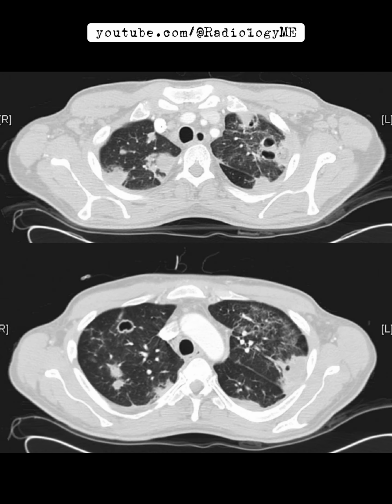Moving on to the axial CT images, and this is where things really come into focus. These images show multiple cavitating nodules, predominantly in the peripheral parts of both lungs. This pattern of cavitation within nodules raises some red flags because cavitating lung nodules can indicate several serious conditions. There's also a variety of other opacities seen on the CT scan, including wedge-shaped pleurally based lesions that are highly suggestive of pulmonary infarcts, which ties in well with the clinical history of haemoptysis.